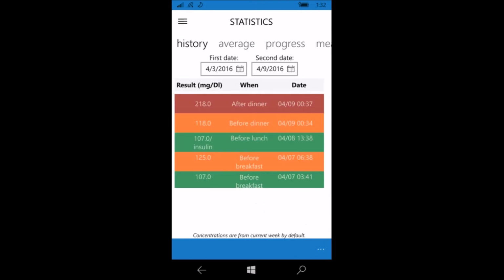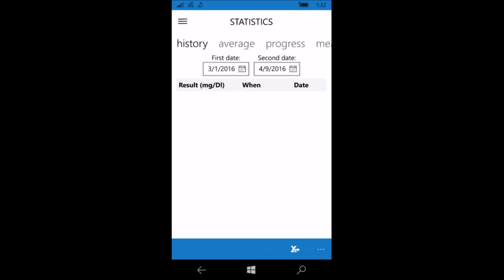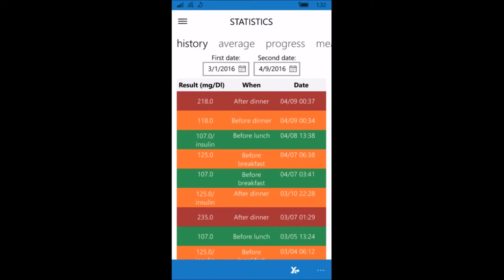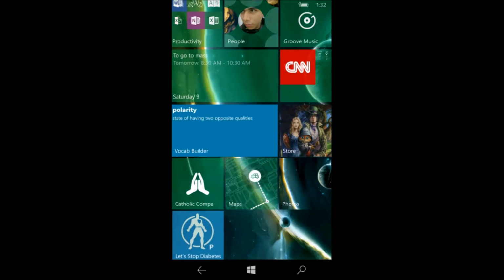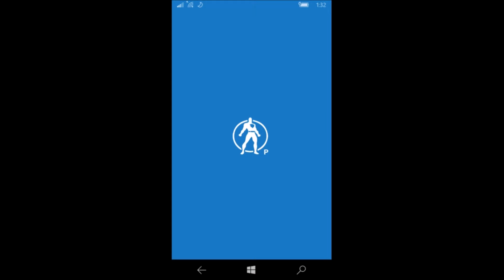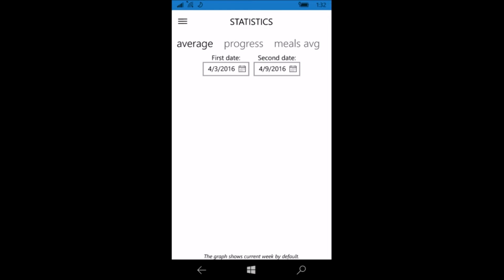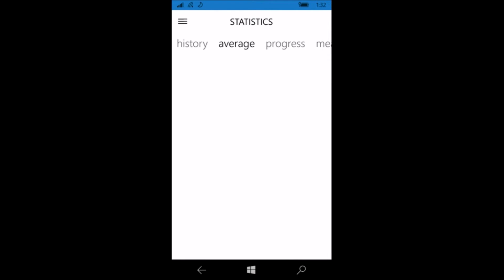And as a standard, later you will see it's even used by other applications similar to ours, but I have seen it more from organizations. This one, you can export the information. You can see the information, as you can see, always the same colors, trying to remind you. The app crashed because I did a double click, I need to block it, in my opinion. We're going to try to export it again. We need to wait some time while it's loading the data.